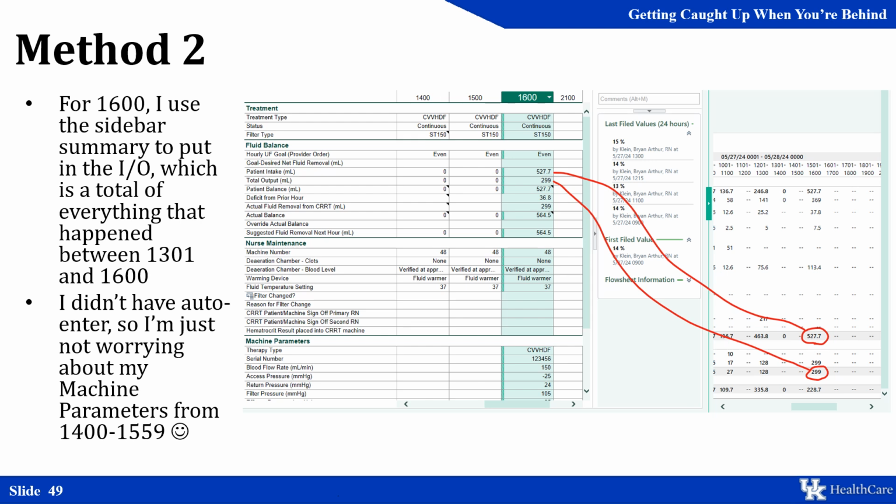Notice again that our patient seemed to have gained quite a bit of fluid. In this case, we weren't able to pull dynamically based on what our patient was needing at the time because we weren't able to calculate it with the flow sheet.